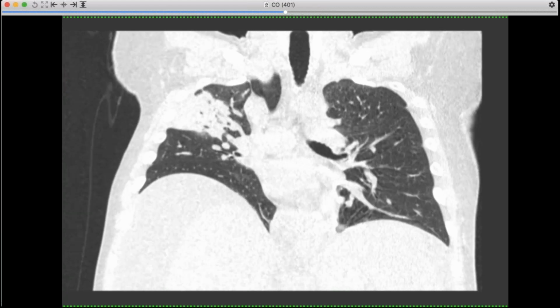But yeah, the fungus that I think of that would look like this would be like a mucor or an aspergillus or even blasto here. Usually it's more disseminated though. All right, another odd fungus for today. Wow. Yeah. So that's my fungus case.